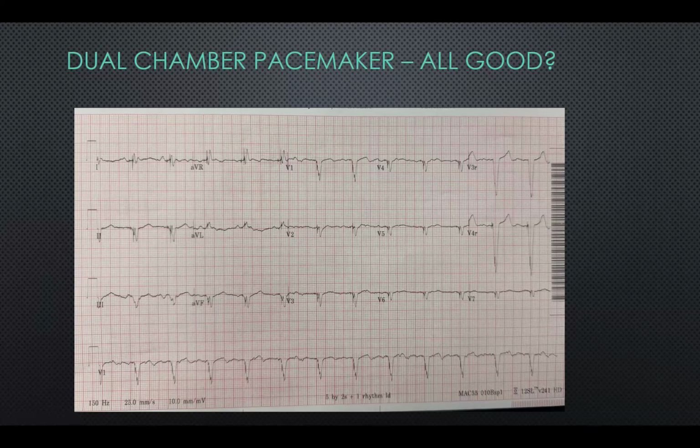And sometimes one of the advantages you have when you're taking care of someone clinically, which I'm not giving you today, is other electrocardiograms of the patient. And sometimes when you pull out an old ECG of the same patient, you realize how profoundly different this is than the patient's usual electrocardiogram. And that would make this, I think, much more obvious that it's abnormal. So this is a patient who's also in flutter with heart block.